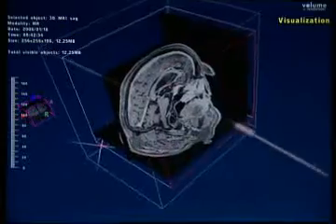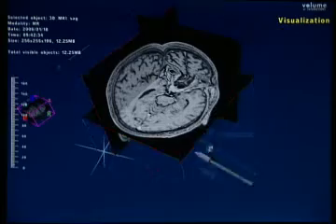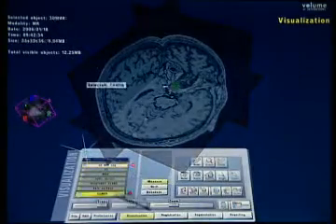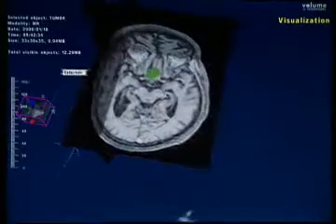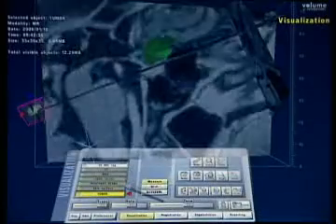And so you can see already just working with 3D planes of the MRI is an intuitive thing. I can easily and almost instantly and simultaneously access the different planes and extract quite a bit of information there already. So now we have segmented the lesion, the meningioma. I'm going to show you this in big, of course. This was the result of our segmentation process. All right. And then there would be the pituitary gland underneath, the pituitary stalk.